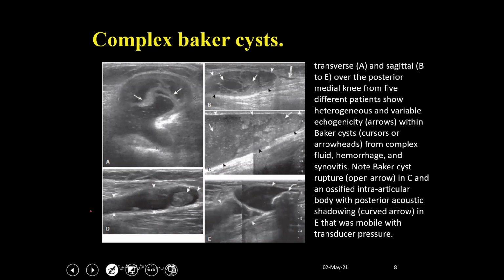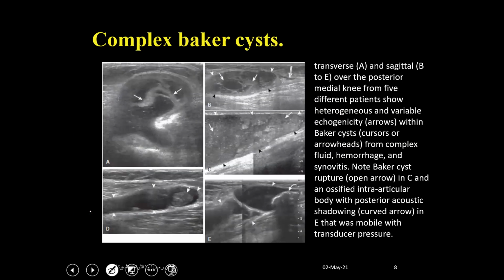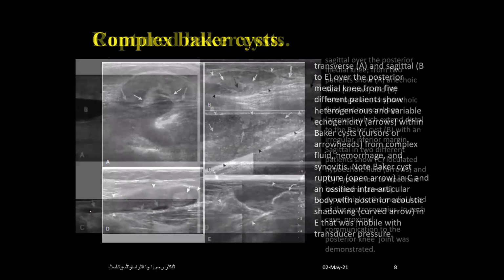This is a complex Baker cyst containing free fluid with low level echoes and some echogenic bodies. So this is complex, you can say an infected Baker cyst as well.